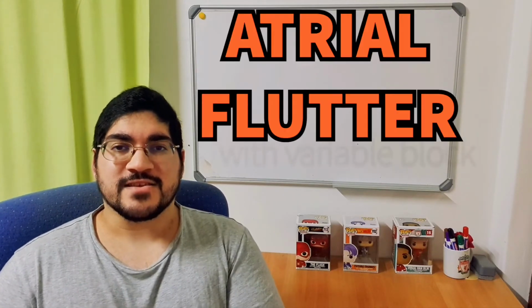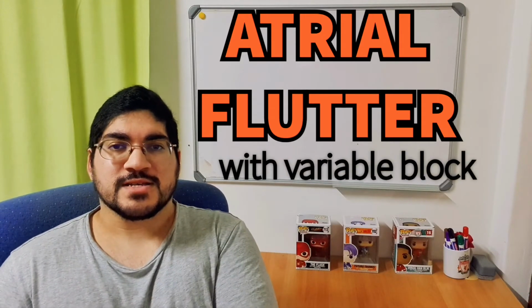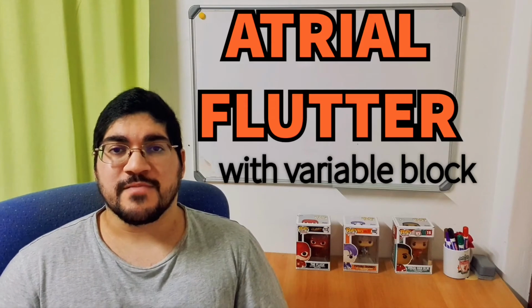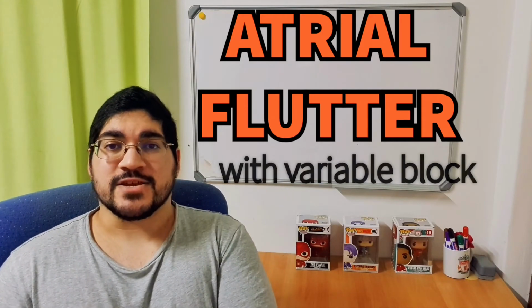And then the second one is atrial flutter. But wait, atrial flutter came in the regular narrow complex. Why is it in irregular? Well, it's in irregular because this is a special atrial flutter. It's atrial flutter with a variable block. So like I said before, you normally get atrial flutter with a 2-to-1 block or 3-to-1 block. This atrial flutter is irregular because the block itself is irregular. Maybe it blocks 2 here, then 1 on the next one, then 4, then 3, then 1. So the beats are actually irregular because the block is irregular.